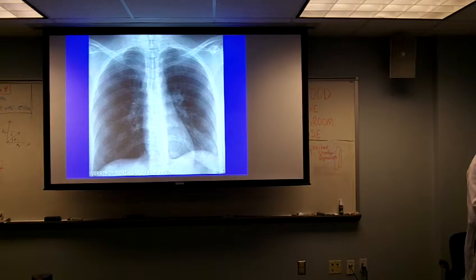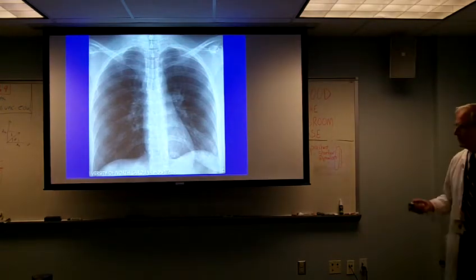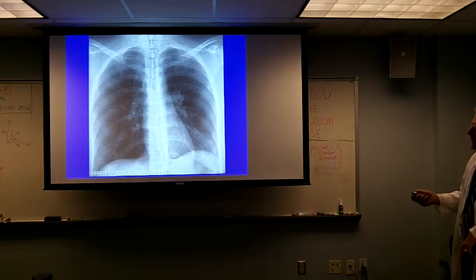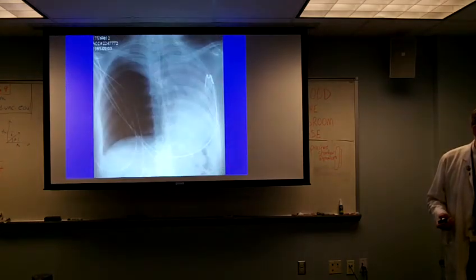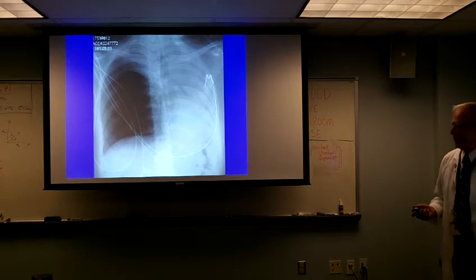Complications. Okay, look at this patient. See where the endotracheal tube is? Mm-hmm. And that's what it looks like 30 or 40 minutes later.